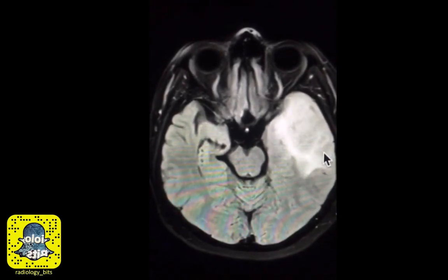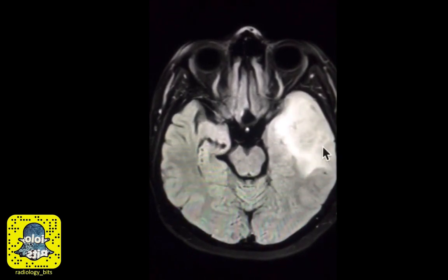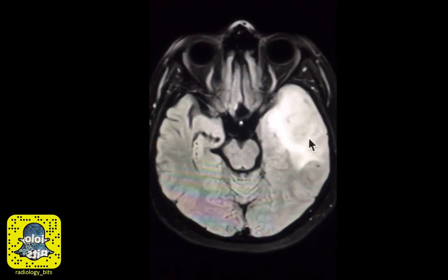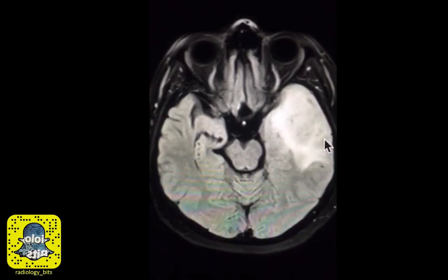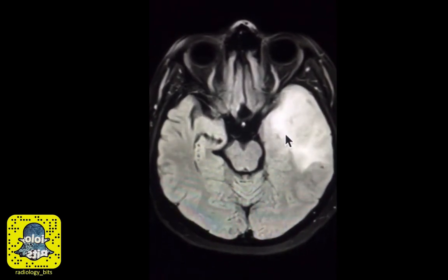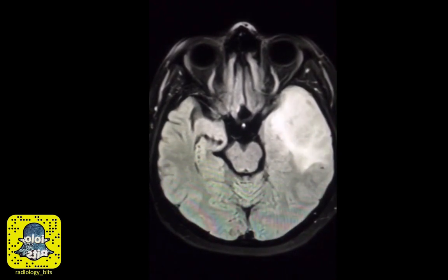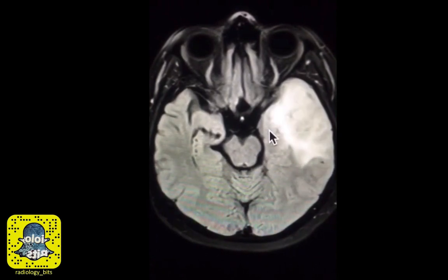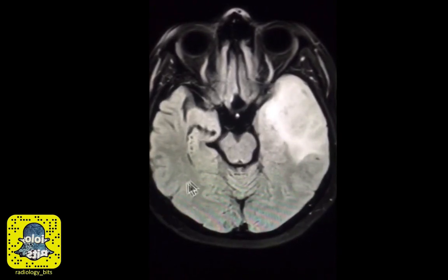Although the cortex appears thickened here and you have a well-defined border between the gray and white matter, this also does not fit with acute stroke, since you lose the cortex if this were to be cytotoxic edema from stroke. An infection that likes the medial aspect of the temporal lobe is herpes encephalitis. However, the presentation would be acute, as we mentioned, and that's typically a bilateral asymmetric process. The right side is normal here.